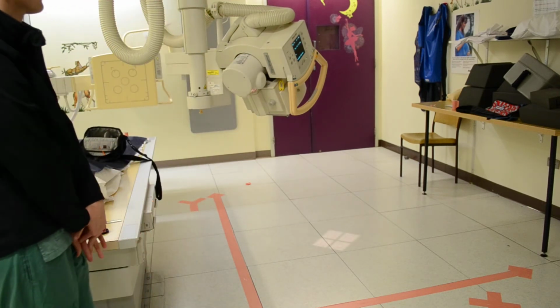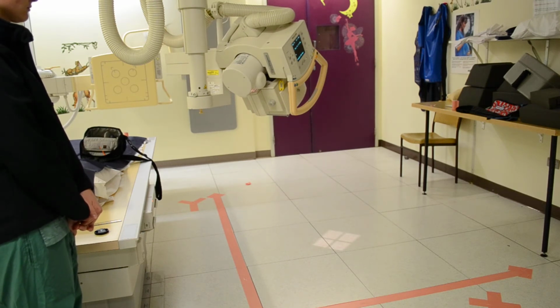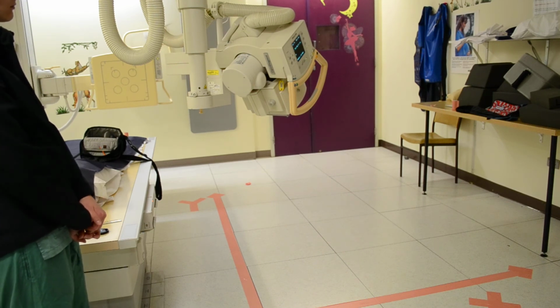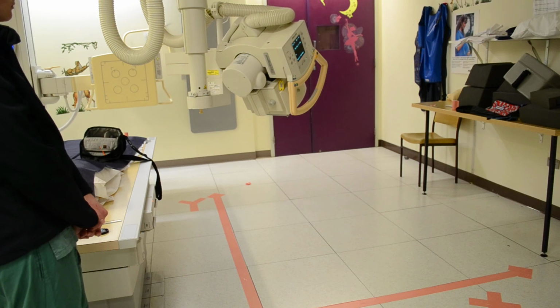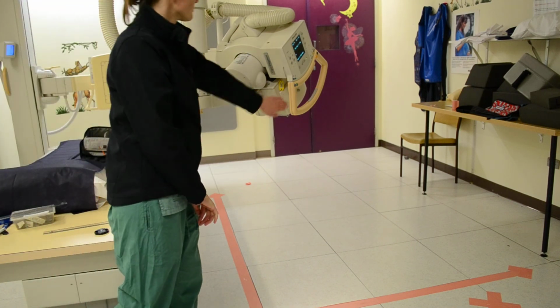What is the angle of the beam along the X-axis, and what is the angle of the beam along the Y-axis? And we refer to this as a compound angle. This is largely a question of mathematics, and we think there is a sine relationship here, but we haven't worked out exactly what it is. The other question is whether, with a 3D model, we can make that movement from X to Y axis and have a continuous readout of the X, Y and Z angles as the 3D model is rotating.